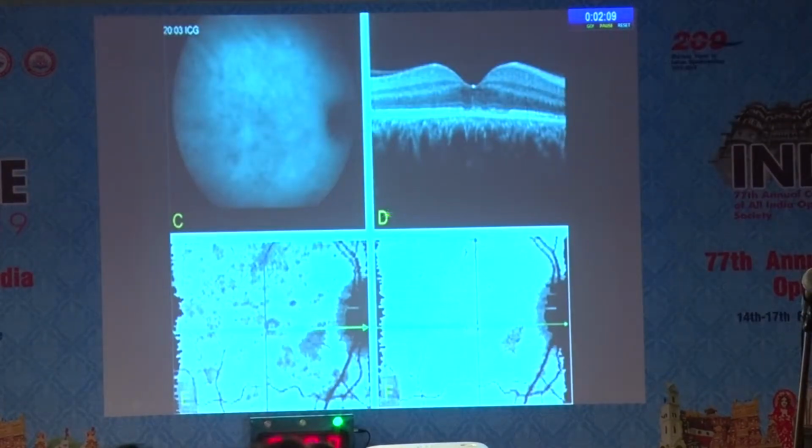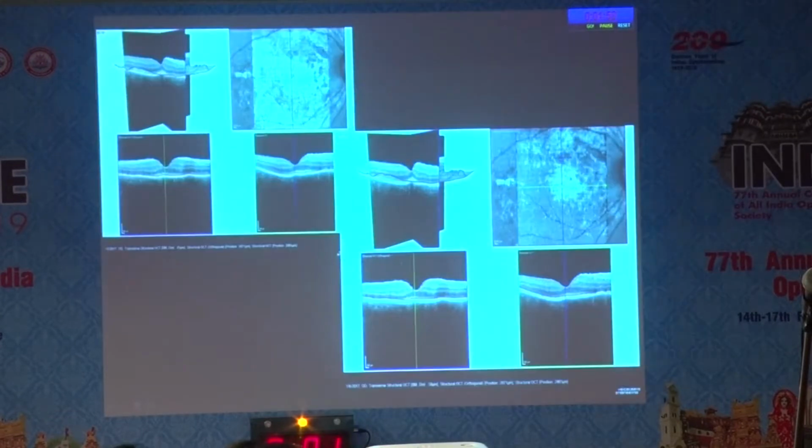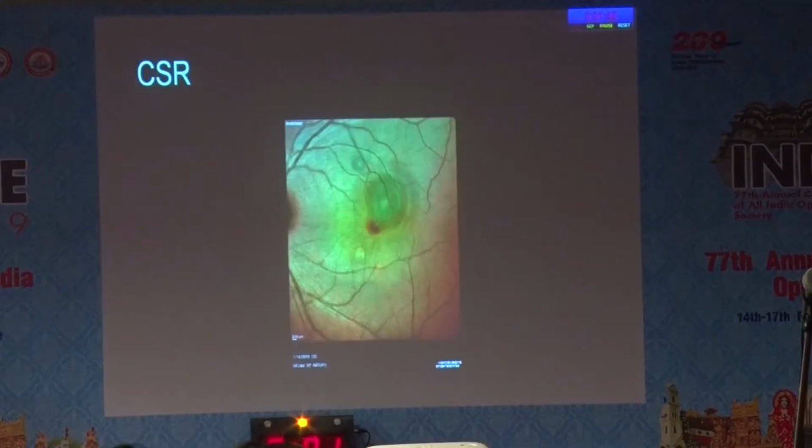Again, in this case, you can see the loss of the photoreceptors at different points during the healing. Posterior scleritis, you see a bumpy choroidal contour, a lot of lesions, and after healing, you see in areas where all those dark areas seem to just go away, and then you have a bit of residual loss of some of the layers.